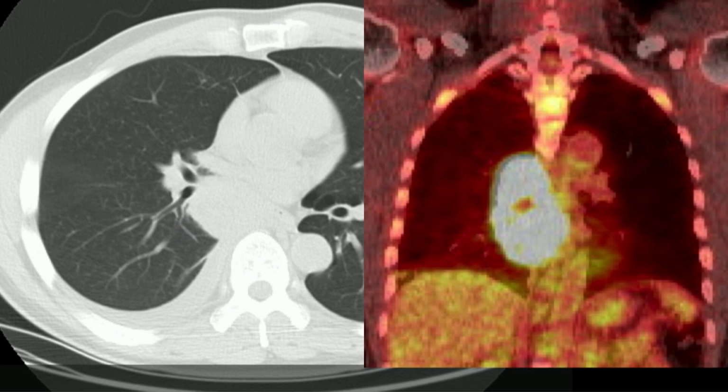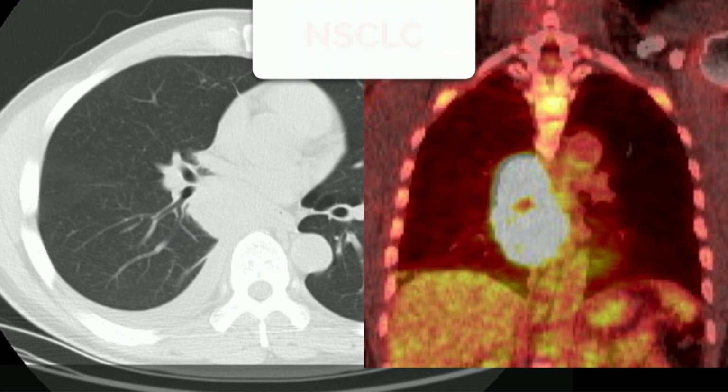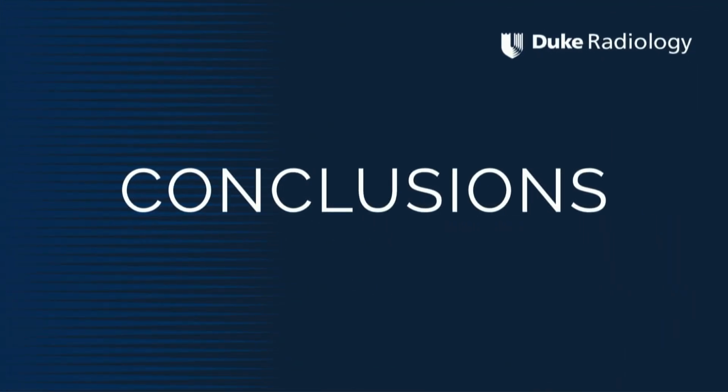This patient went on to get a PET. You can see it's fairly extensive. And this was a non-small cell lung cancer that was really kind of hiding out in the azygoesophageal recess.